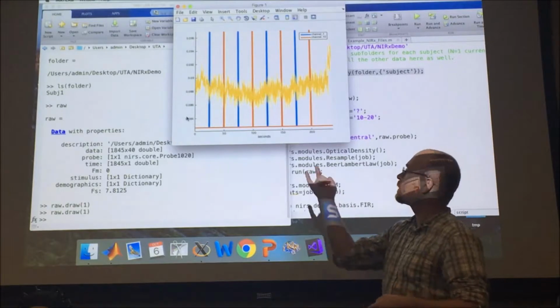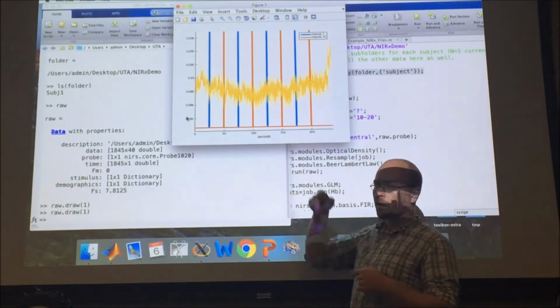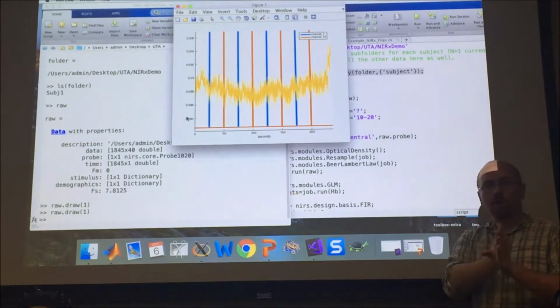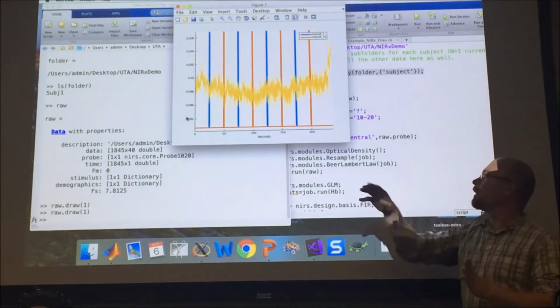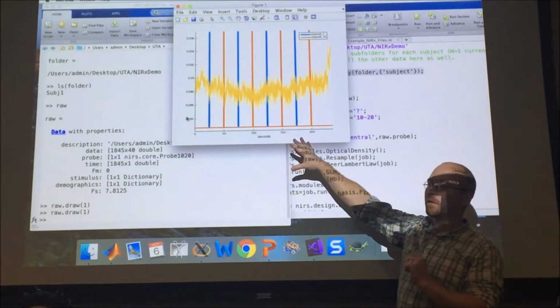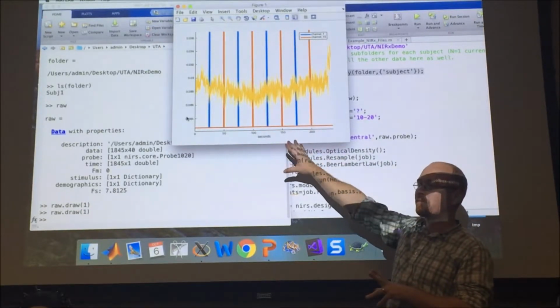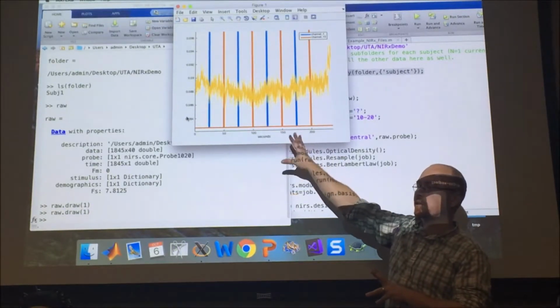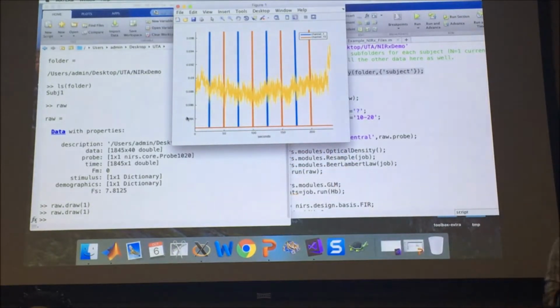And there's no information that this was actually 10 seconds long. If we had set up our E-Prime or whatever to know that it was on for a block, it would automatically appear as a block. But because that's not how this NIRStim presented the data, we need to modify that right away so that we know this was actually a 10-second block, okay?